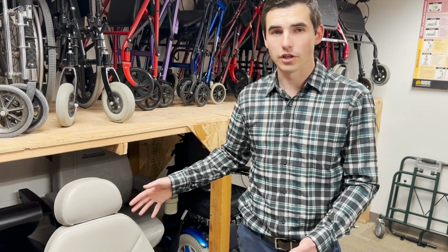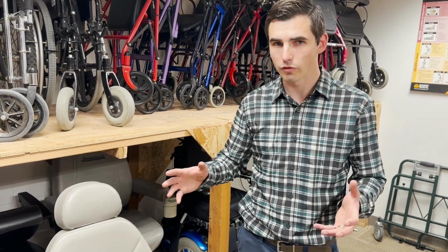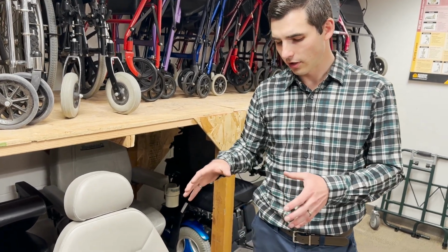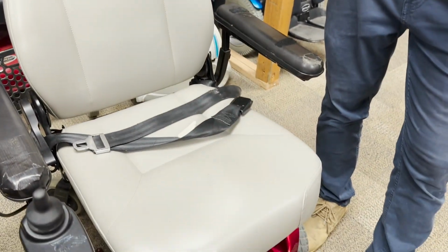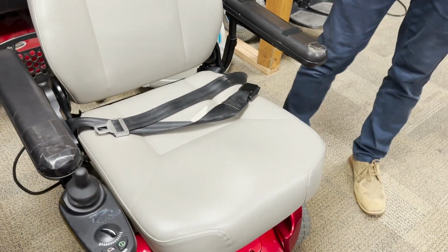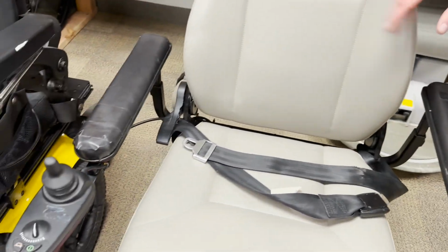Looking at this wheelchair here, this is again for someone who is able to get up and move around a little bit, possibly. It is similar to a car seat where it's not customizable, it just is the size it is. The armrest on this could slide out or move up or change the angle, but the seat itself is pretty well fixed.